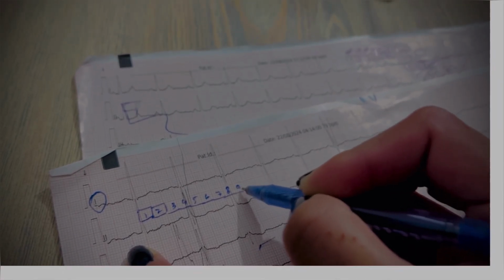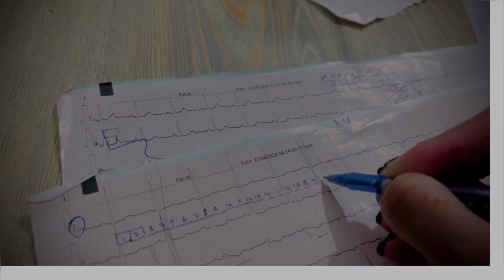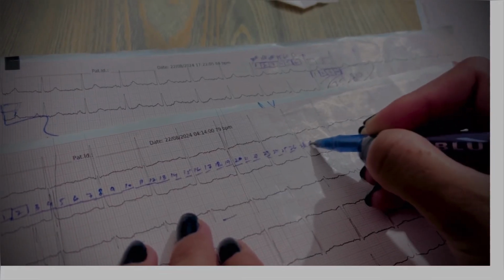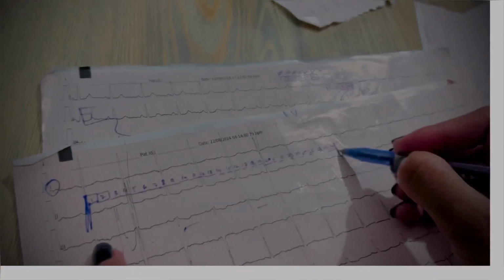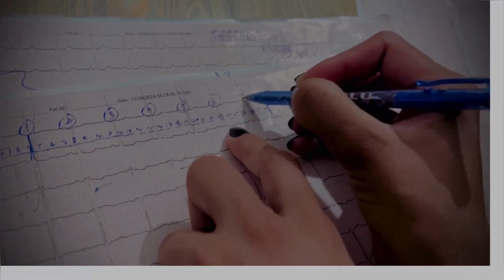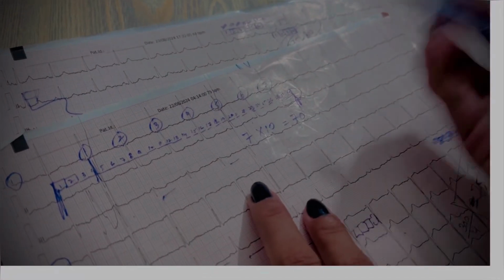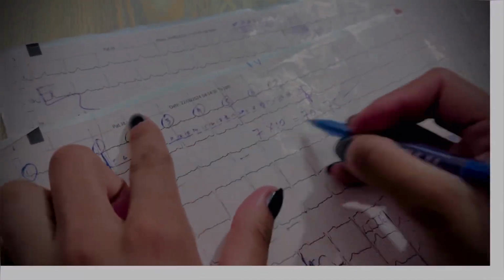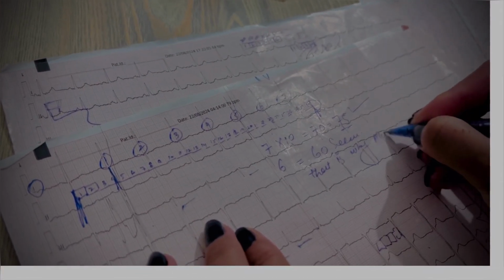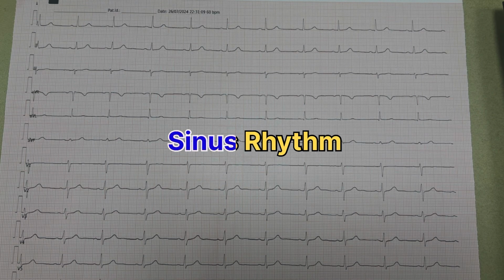Now let's talk about how to calculate the heart rate from an irregular rhythm. We'll start by taking a 6-second strip of ECG, which is equal to 30 large boxes. Then we count the number of R spikes, R peaks, within 30 large boxes. Once we have that number, we multiply it by 10. Here I have 7 R spikes within 30 large boxes. Then I multiply it by 10, which is equal to 70. So 70 is the heart rate within 60 seconds. I multiplied it by 10 because I scaled up 6 seconds to 60 seconds, 1 minute.